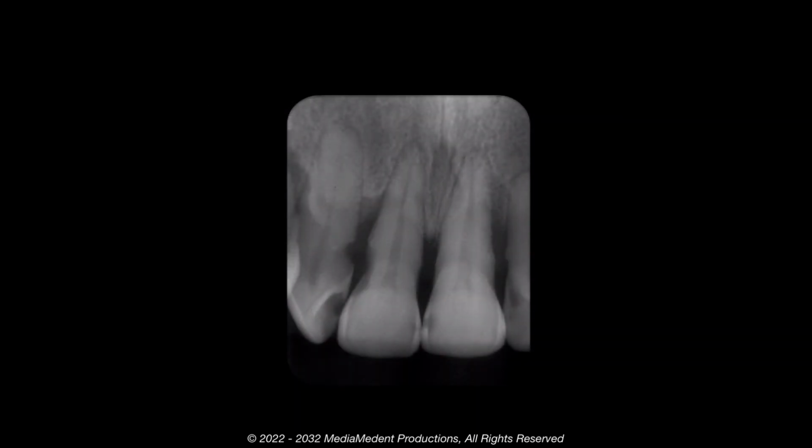After the lesion penetrates the dentino-enamel junction, it spreads laterally and superiorly and inferiorly in the dentin. The arrow in this radiograph is pointing to a lesion that has progressed to this stage on the mesial of the maxillary right central incisor. Note there is a similar lesion on the left central incisor.